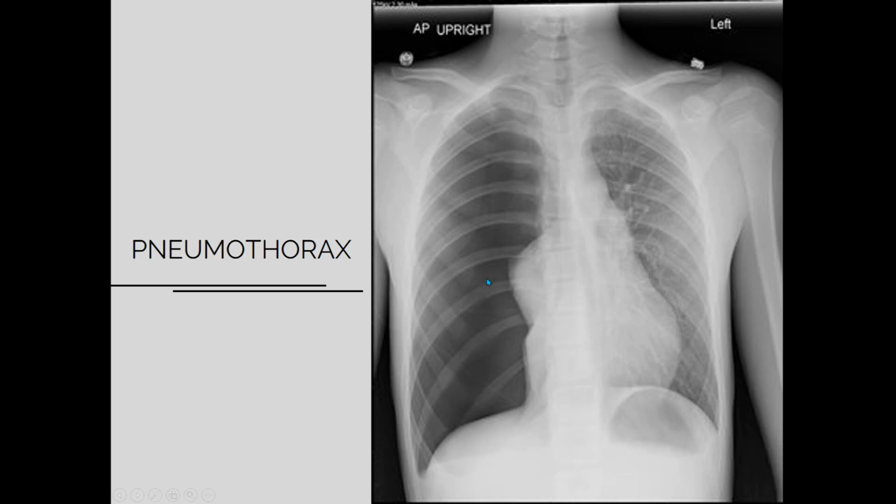Inshallah, in the next slide, I will tell you how to write down the findings clearly in your exam. Let's see. Another important thing is that this is an AP X-ray. Why AP? Because you can notice the scapular margins and the clavicles are a bit straighter. But why upright? Because you can notice the gastric bubble. So this is AP but upright.